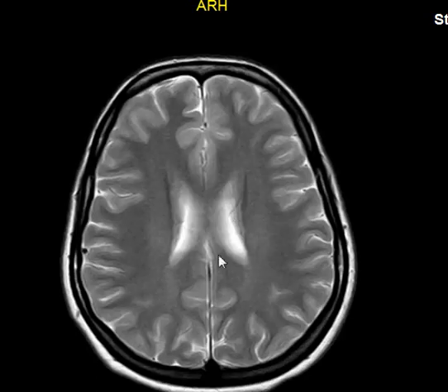So first, the dura mater is a very strong fibrous tissue. Fibrous means just fiber. No protons, no fluid, no hydrogen, means dark. In all sequences, T1 and T2 and the FLAIR and whatever, it is dark. So we see it as a dark or black line in all sequences, all images. You can see this thin line here, also here.